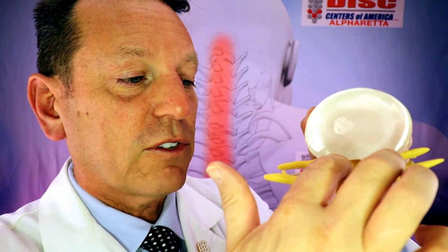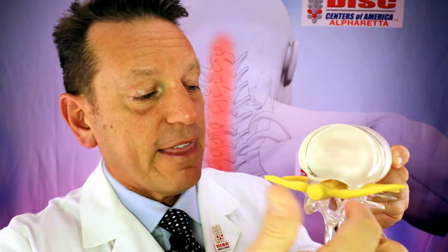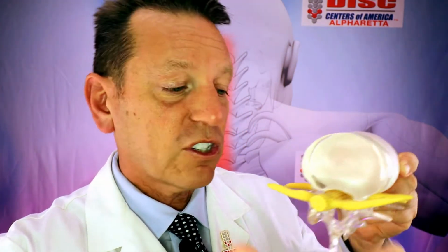It's either going to go into the area where the spinal cord sits around in the thecal sac, and sometimes it'll push into the thecal sac and create a thing called central canal stenosis. What that basically means is that that tunnel where your spinal cord is trying to get through, which should be nice and big, is now becoming smaller because you have disc material pushing into that area. Sometimes they'll say that there's indentation of the thecal sac or the spinal cord. What that means is that that inner nuclear material that just squeezed out, what you just saw, is actually starting to push onto the spinal cord and deform the shape of the spinal cord, which is not what we want. The other thing that can happen is that disc material can start to push out into these areas right here.